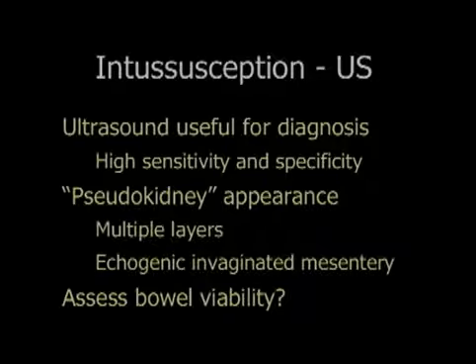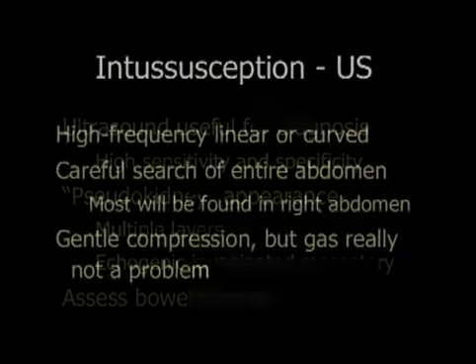If you know what you're doing, you can easily see these intussusceptions. They have a pseudo-kidney appearance with multiple layers. Several authors are looking at whether it's worth assessing bowel viability to see if children are candidates for intussusception reduction, either by fluoroscopic or ultrasound means.